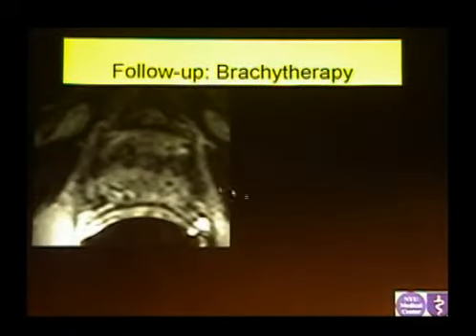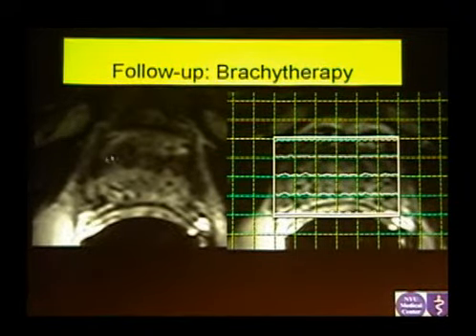Another patient we had also had multiple seed implants. Usually what happens when you use radiation therapy or seed implantation is that the prostate shrinks down, it's shut down basically by that treatment, and gets very small, atrophic, fibrous, and low T2 signal. It's extremely difficult to detect recurrent disease based on these findings. So imagine a dark background. It's very hard to see a dark tumor on top of that. So the only way to detect cancer recurrence in patients with radiation therapy is either spectroscopy or contrast enhancement, okay?